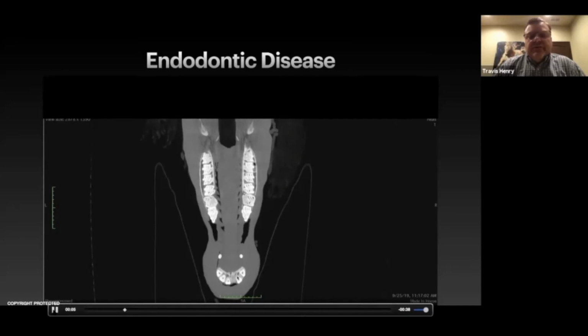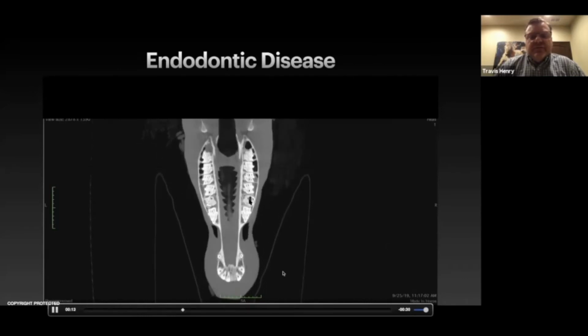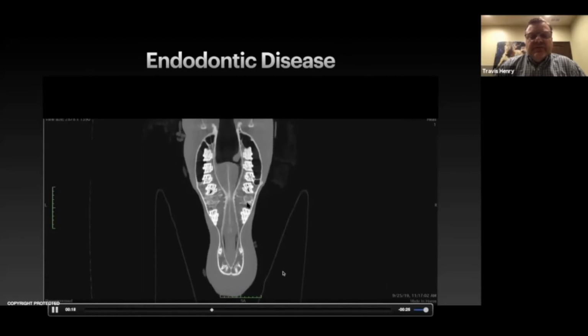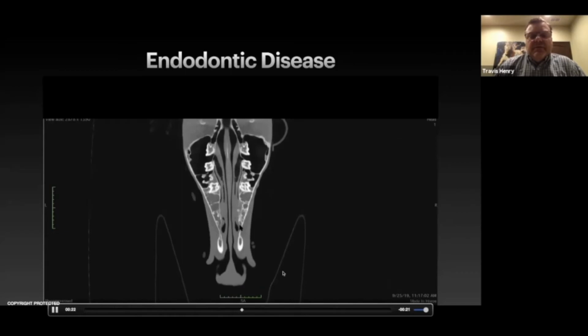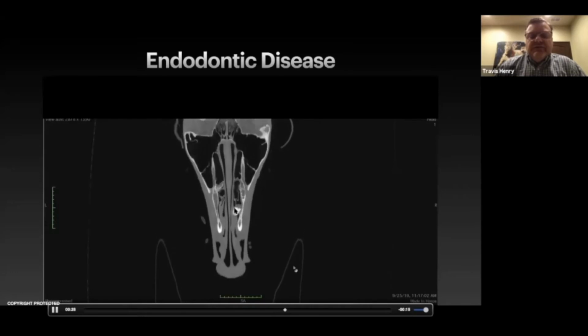And so when we performed a CT on this horse, it was kind of interesting what we found, and we confirmed with radiographs as well. But I want you to watch in this region right here. So we're going right down to the bottom of the occlusal surface, and now we're going to work our way up into the nasal passages. So we're going to see the apex of the 7s kind of leave here. And then as we go a little farther, we start to see an alien show up here, or some type of dental material density in the nasal passage of this horse.